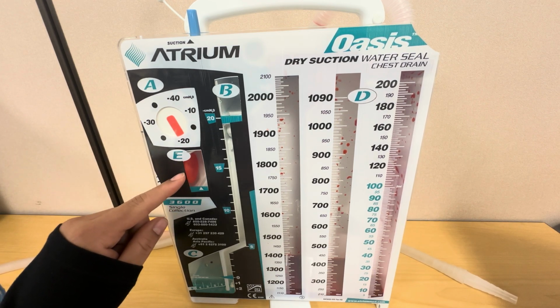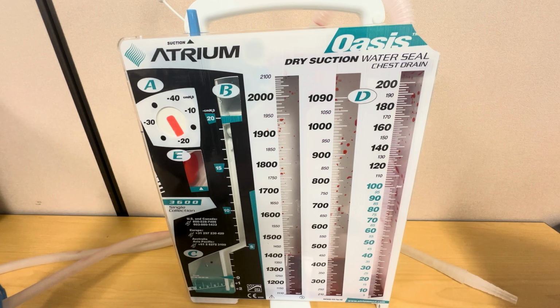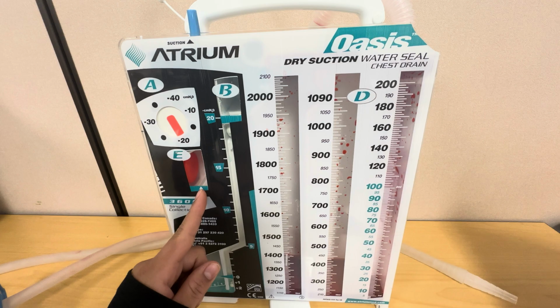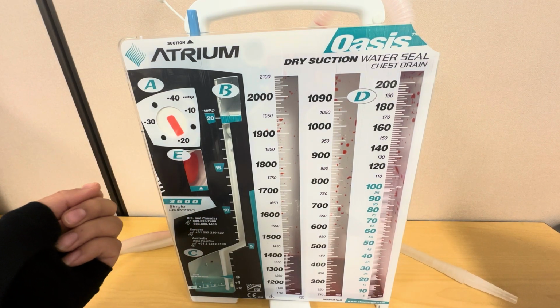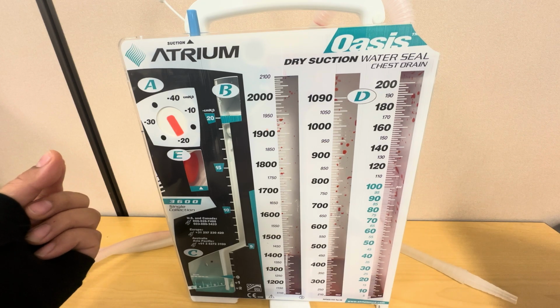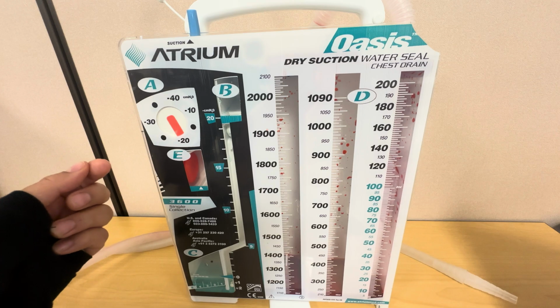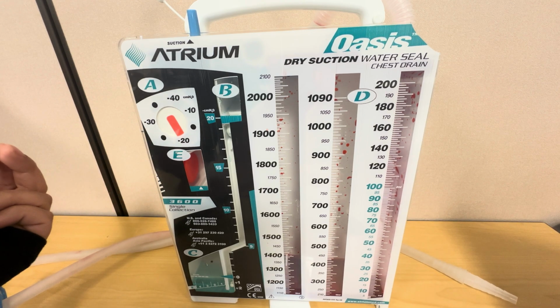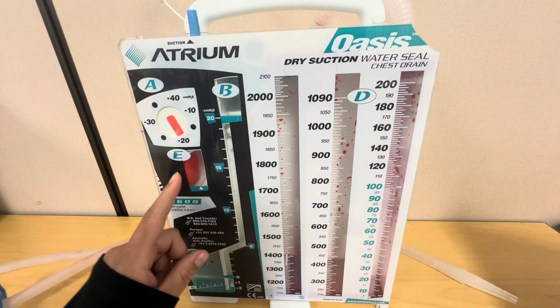Here in section E, we have what's known as a suction monitor bellow. So usually when the chest tube is connected to the wall suction, this will inflate out up to this triangle right here. So this just lets us know that the suction is in fact working. It's important to note that if the patient is not connected to suction and whatever fluid is being extracted from the pleural space is being done by gravity, then we won't see this blow up to the triangle area.